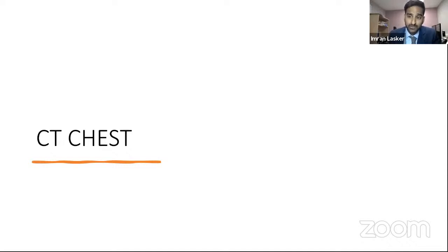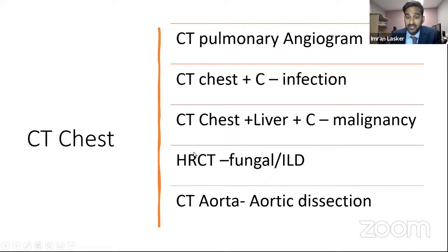A CT chest is just a CT, a chest is just a part of the body, so just zap the patient. What more do you want? It's a little bit more complicated than that. It really is, I promise you, and I'll show you. CT chests can be CT pulmonary angiograms. You're looking for a PE. All right, chest pain, PE.